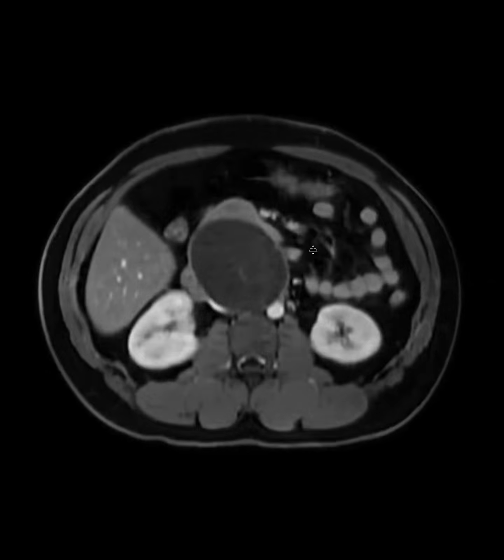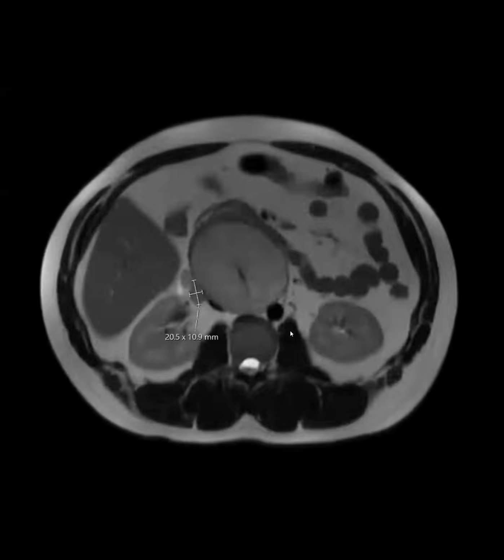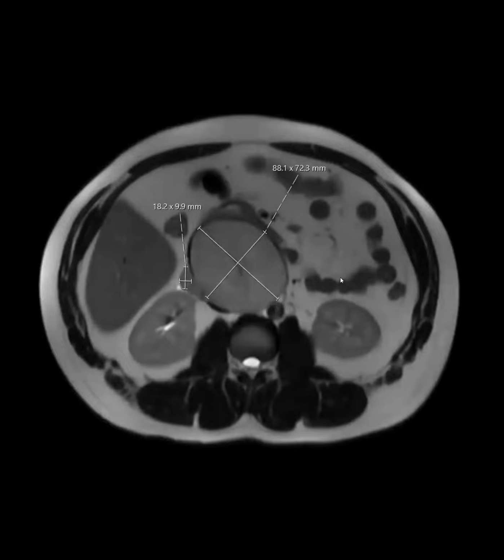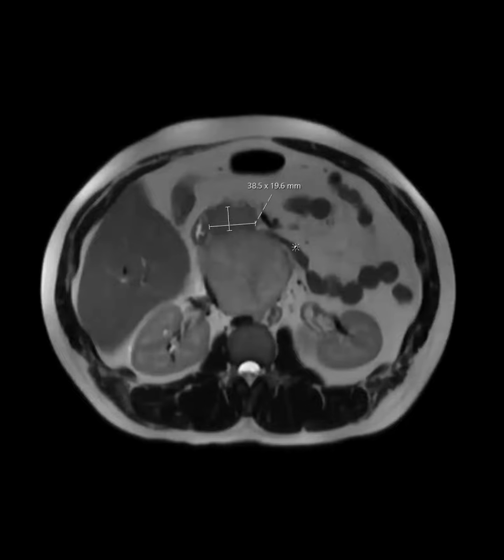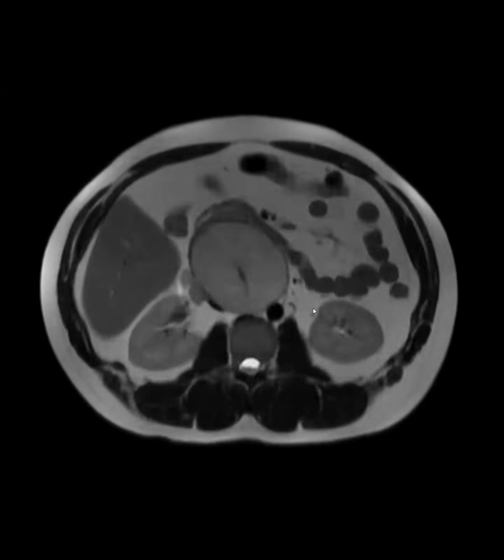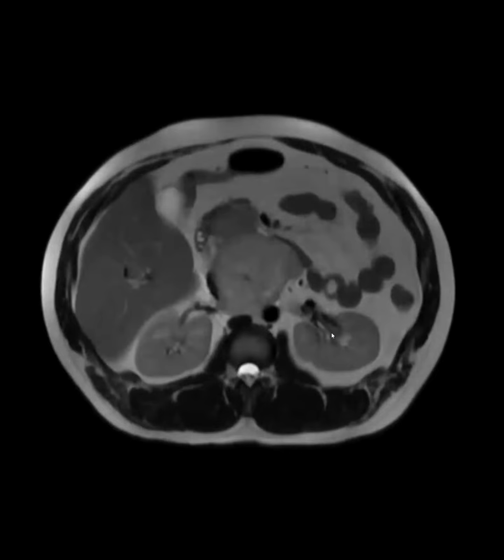So, in that location, I want to think about some kind of neurogenic tumor. I think the other thing I would consider is a neuroendocrine tumor, like a cystic neuroendocrine tumor. And I'll show you again, this big blobby part is not enhancing, which is pretty impressive, given that it looks like this on T2. It looks like a solid mass, but it's pretty non-enhancing. So you're thinking neurogenic tumor. Yeah. I'm still not sure if it's coming from the pancreas or not, but if it was pancreatic, I'd put cystic tumors, which can kind of look like that. But I think it's not pancreas. That's my feeling.